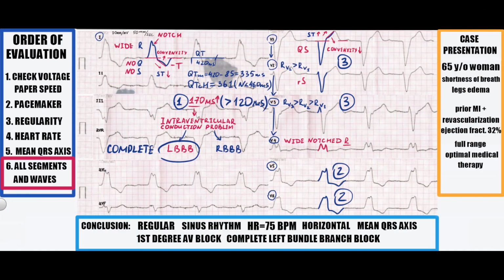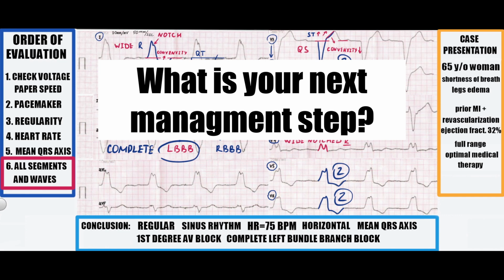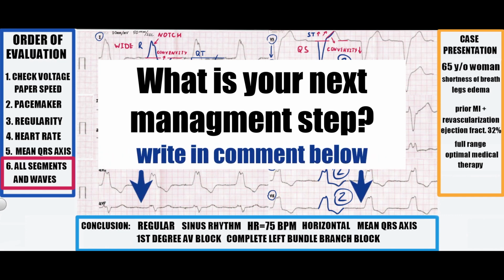And now the final question for the advanced. What is your next management step? Write your thoughts in the comments below.